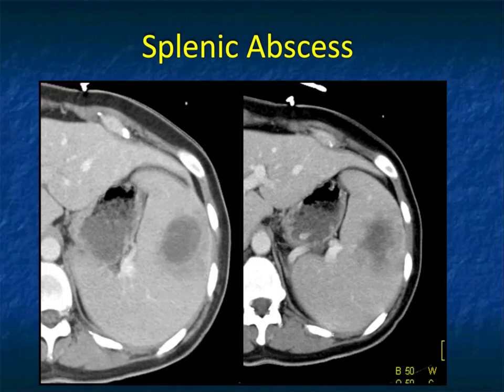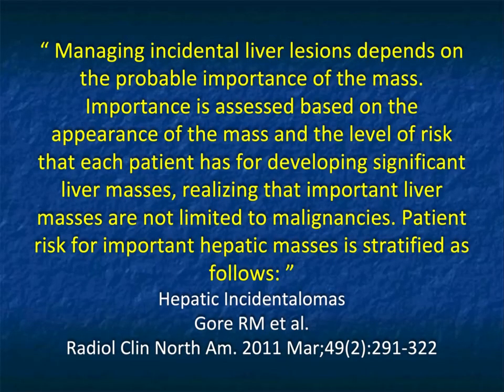It's not well-defined. It's not sharply marginated. There's no way you can call this a benign lesion with all the perfusion changes nearby. So that becomes a very important factor.